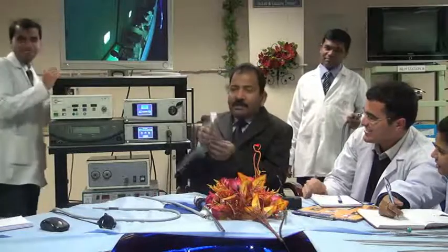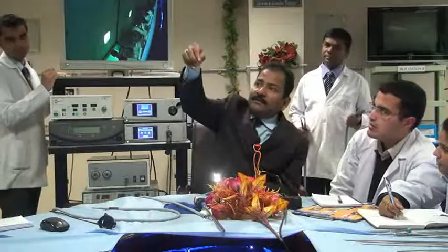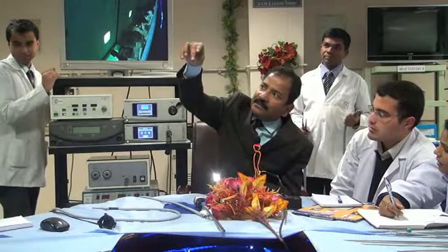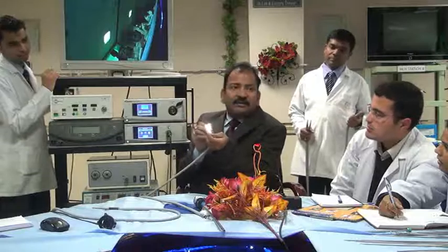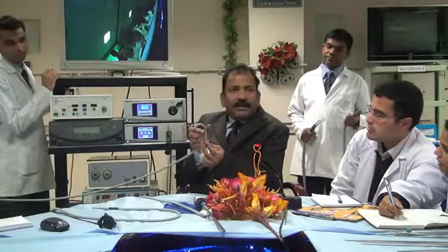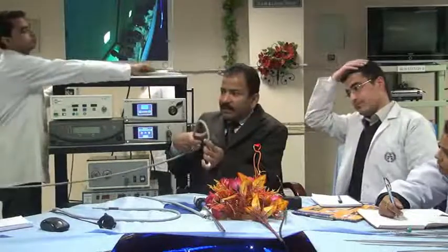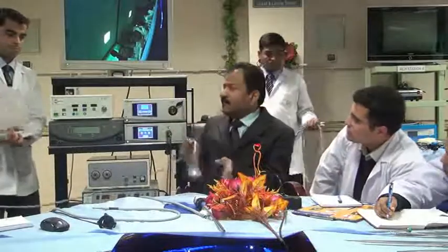But remember, if you bend it like this, see here, I have broken so many fibers. Do you see that? These fibers are very fragile. That's why you can't bend it completely. Keep the light cable down when holding the camera, so that if someone hits the abdomen of the patient, it is not damaged.